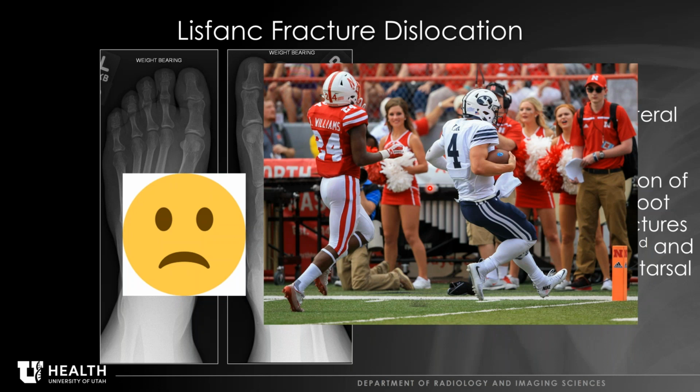So there are three ligaments in the Lisfranc. There's a dorsal, an interosseous, and then a plantar, and the interosseous is the strongest. And you can have tear of all three ligaments or not. So that's the Lisfranc fracture.